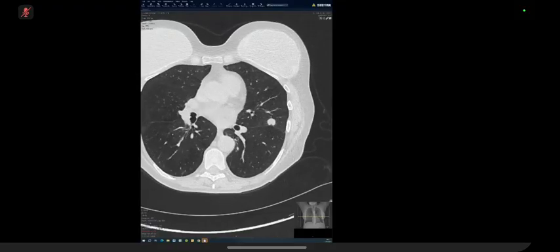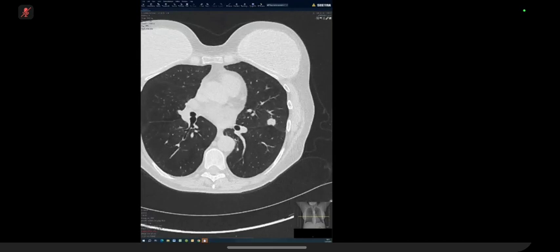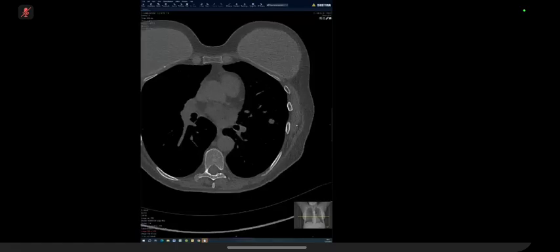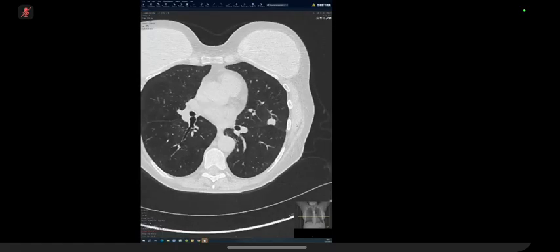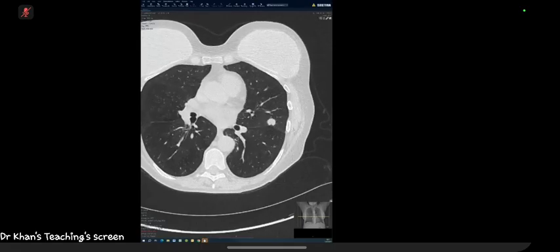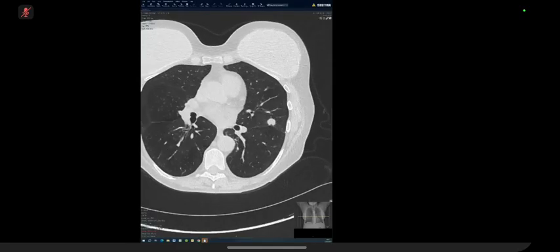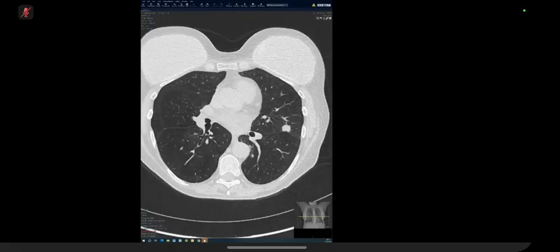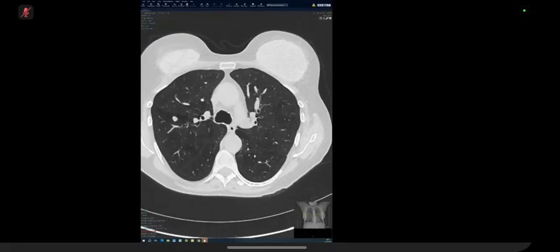And it's solid. I'm trying to see if it's homogeneous or it's got any calcification within or anything like that. It looks completely soft tissue. What else is it doing morphologically? It's pulling the oblique fissure anteriorly. It's causing traction. So what does that imply? Implies that it's invasive.